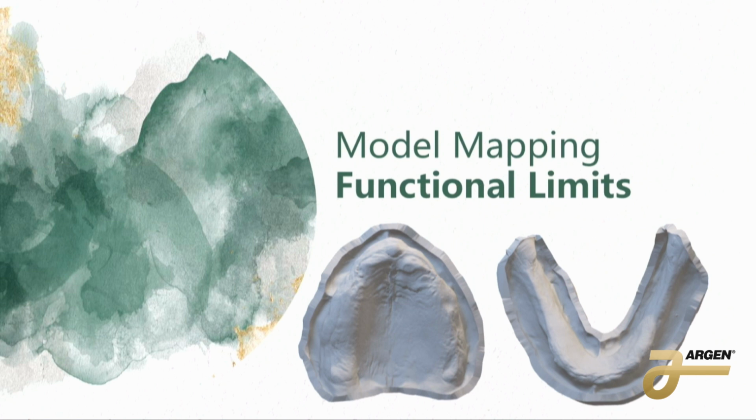The reason why I still really suggest doing it in the model and not just adding it to your wax up at the end is because on the model we see all of the anatomy. So we can still make sure that we're ending our post dam at the right spot. If we're ending it at the right spot, then we can draw our boundary to the right spot, right? If we just draw our boundary willy-nilly and then we go add it at the end, it might not be in the right spot.